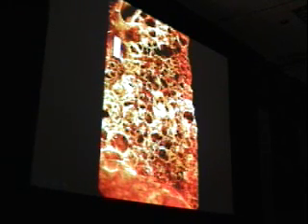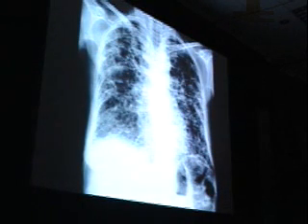It's an end-stage organ. Not that much different than end-stage liver, end-stage kidney when you see it. Hard to know where it started. But the common causes, as we said, include eosinophilic granuloma, sarcoid, and pneumoconiosis. This one, which you see, again, large, thick-walled, cystic areas throughout both lungs. This is end-stage lung. Hard to know where it started. Historically, it turns out this is eosinophilic granuloma.